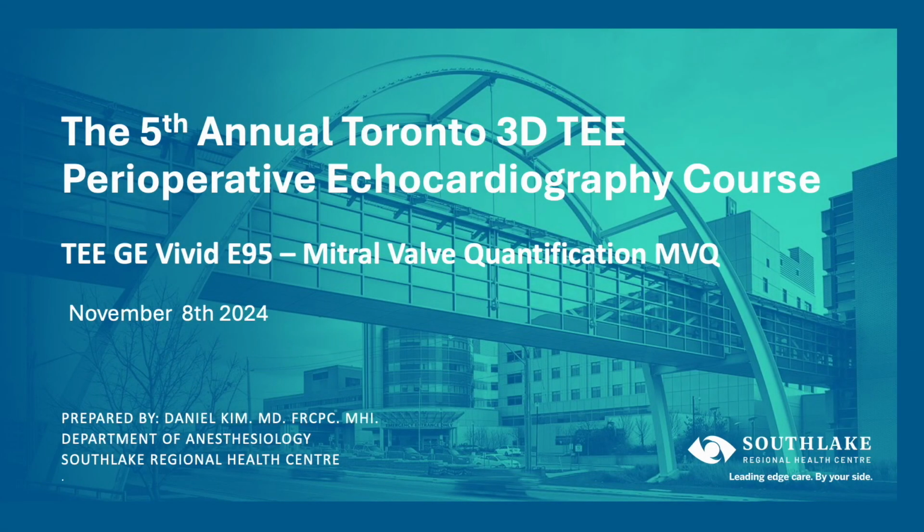Hello, this is the 5th annual Toronto 3D TEE perioperative echocardiography course. This particular lesson is on mitral valve quantification on the GE Vivid E95 platform from a TEE perspective.